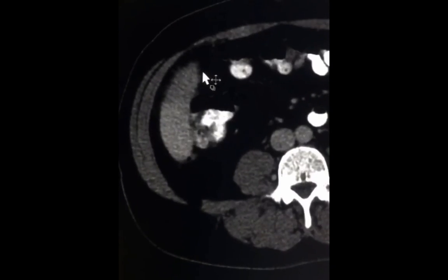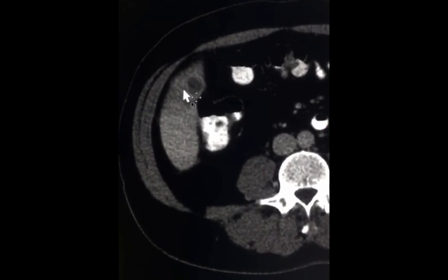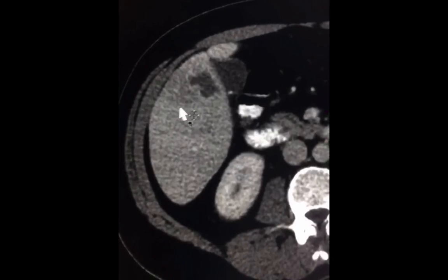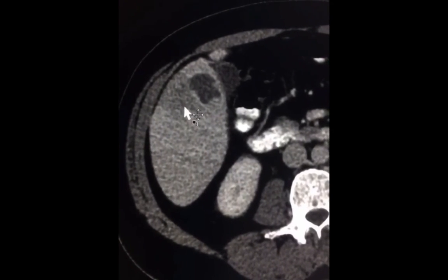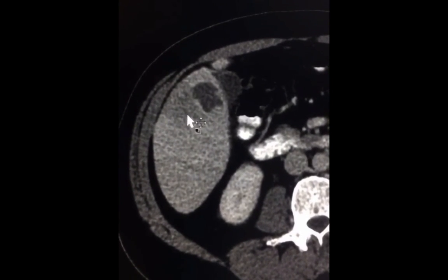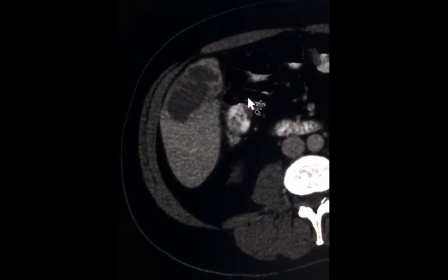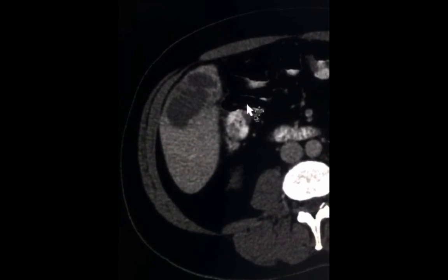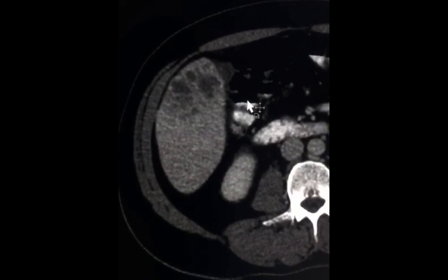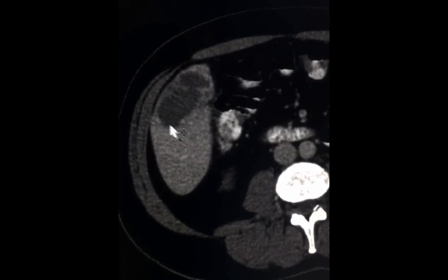And interestingly enough, what we saw initially on the arterial phase as a surrounding area of hyperemia appears hypodense here. Such surrounding hypodensity on the portovenous phase is consistent with edema, which is another sign that tells us that the hepatic parenchyma is inflamed. All these features are consistent with an infection, which could be pyogenic, amoebic, or due to hydatid disease. Now, hydatid cysts have various appearances when they involve the liver, but the surrounding inflammation would be unusual.